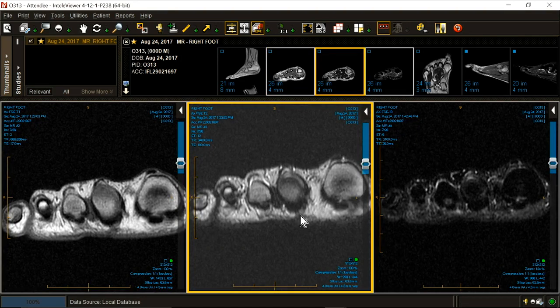Diagnosis: Morton's neuroma. What is a Morton's neuroma? It is a fibroinflammatory reaction around the digital nerve that is locked or sandwiched between the ligamentum metatarsum transversum profundum and superficiale. So there's a superficial ligament, there's a deep ligament. Can you see them? You could if you had a microscopy coil.